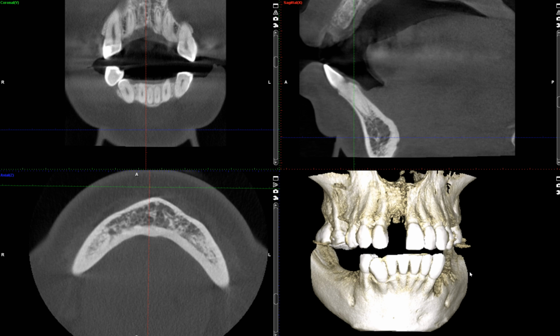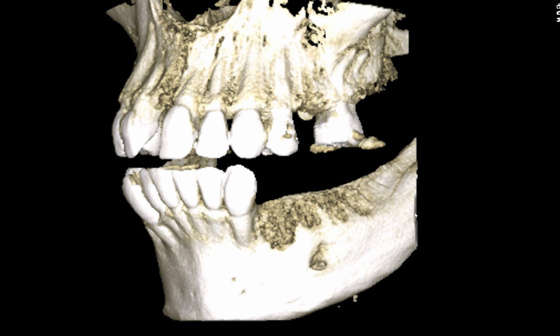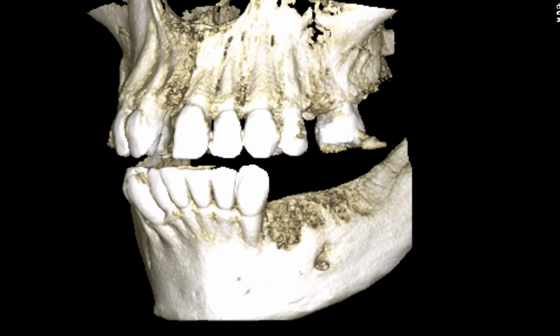Well, before I go further, let's clarify what the incisive nerve is. We all know what the inferior alveolar nerve or mandibular canal is, right? So from this 3D rendering, we know the mandibular nerve courses anteriorly, such as here, and one of its main branches exits through the buccal cortex, which we call the mental foramen. But the other branch courses anteriorly, such as this, and continues to supply the nerves to the mandibular incisors.